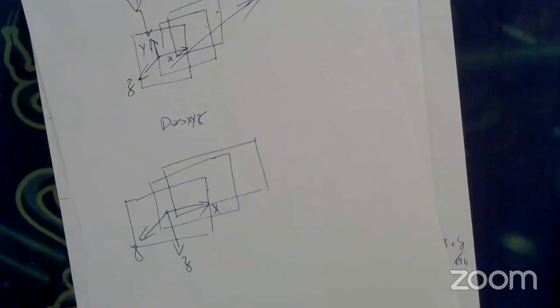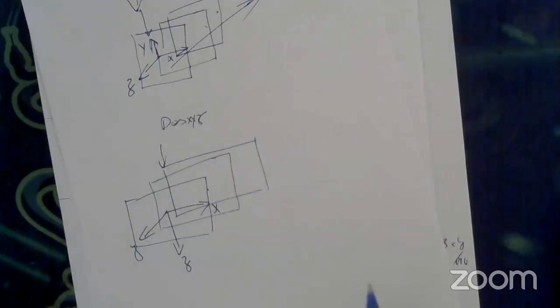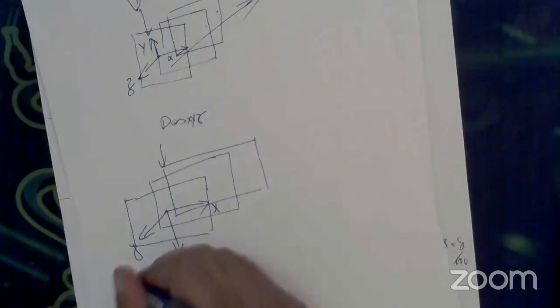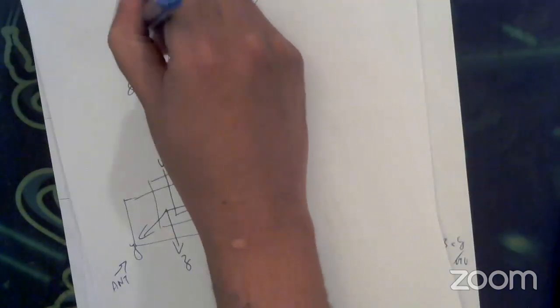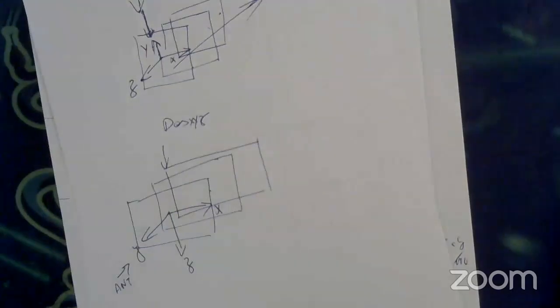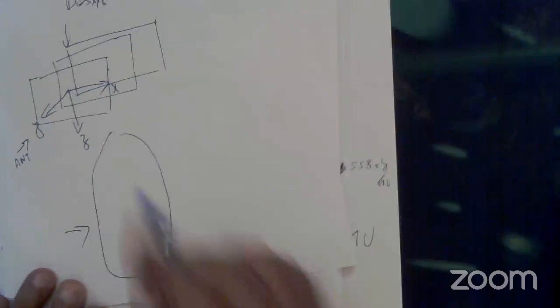For now, when we put the patient, okay, the X, Y, Z, the patient, this is not the direction of the anterior. No, the direction of anterior is this. This is the anterior view. Because with Eclipse, this is the Y direction. This is your anterior. So as if the patient is actually lying like this. I don't know how to draw it properly, but it's a bit different. So this is the confusing part, and you have to be careful about it.